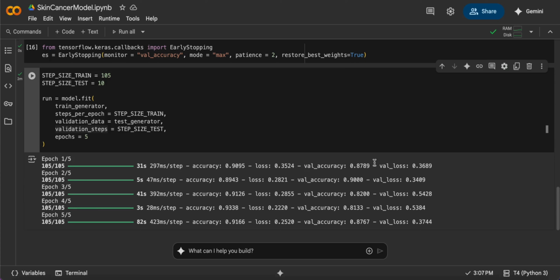Even if your accuracy starts out pretty low, it should reach its peak at around 90%, which is also my peak. Now your validation accuracy matters more than your training accuracy. Finally, your loss should be going steadily down in both your training and your validation. Now if you want, you can run this for more than 5 epochs. I just chose 5 because I thought it would be a pretty good number to start with. But you could even try 8, 10, or 9 and just play around with different numbers and see which one gives you the best result.